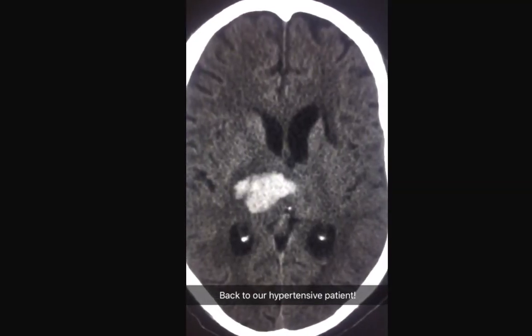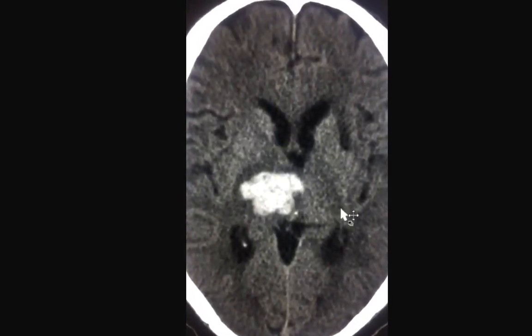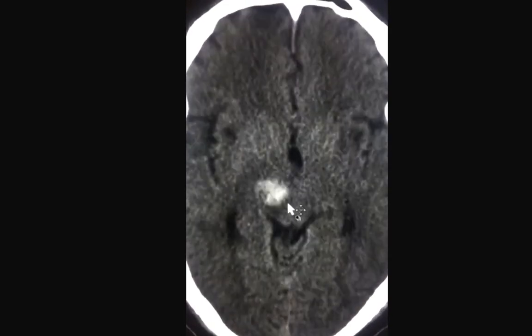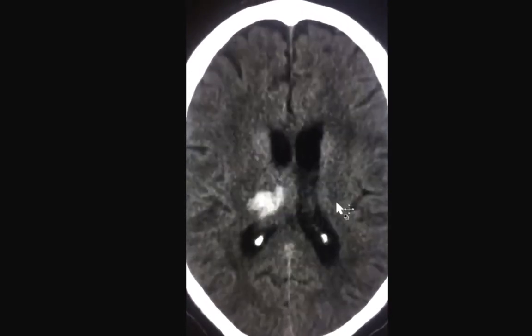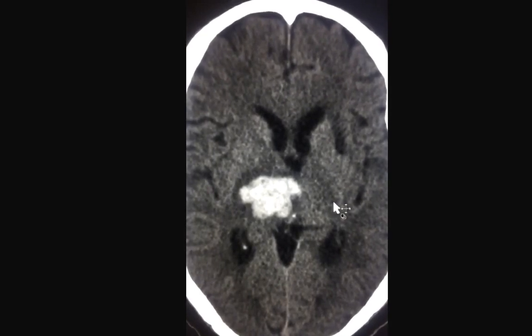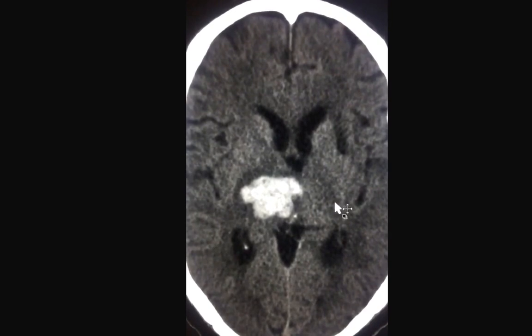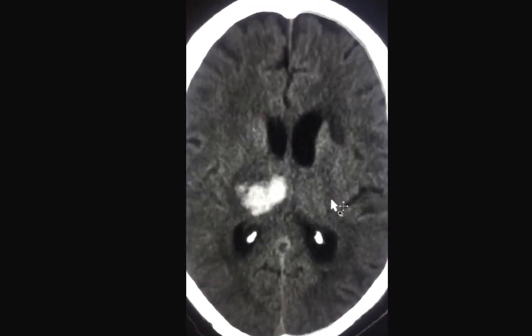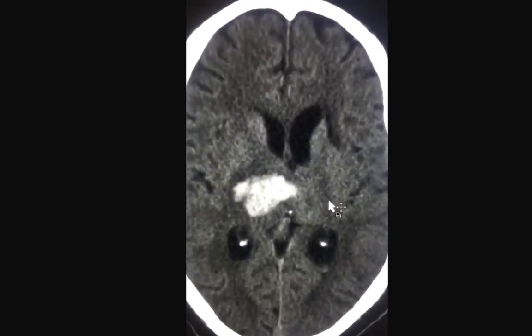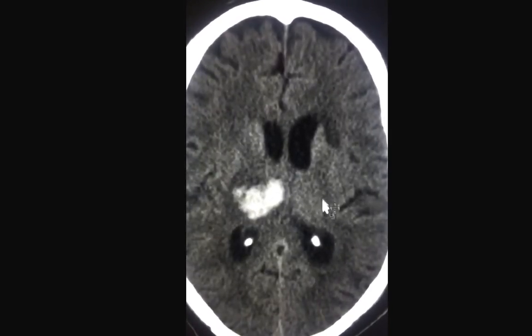Now that you know the anatomy, let's go back to the abnormal case. There is a bright hyperdense abnormality that you could easily locate within the thalamus. Important things that appear dense on a CT scan would include intravenous contrast enhancement, acute hemorrhage, and calcification. So this is a hemorrhagic focus that is acute within the right thalamus. Compare that to the normal left thalamus.